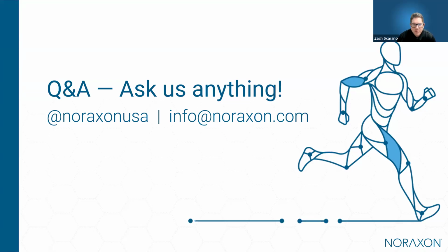Is it possible, for example, for audio biofeedback from the app related to the activation of specific muscles? Great question. That is one of the features of the app, that you can enable audio cues which interact with the set thresholds, and these can be set up or enabled per channel. So you can establish that threshold for, let's say, channel one.